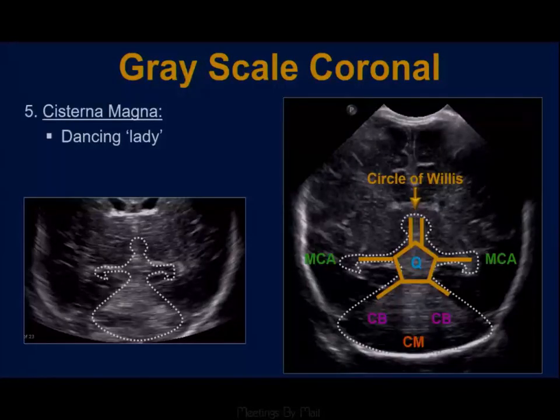So in your syllabus, I put a whole bunch of slides in for different imaging planes in the coronal and sagittal, and just pointed out the normal anatomy on those slides. And I just want to highlight 3 of these slides in each of these planes for you. So the first one is, I want to highlight the slide where you're doing a coronal image, but you happen to catch the posterior fossa.